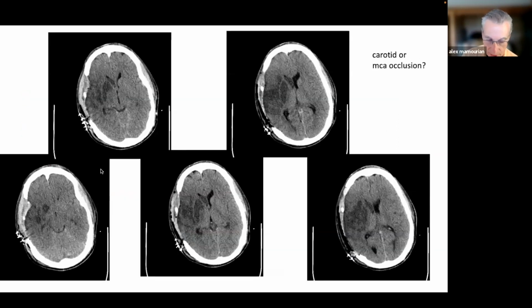So let's look at this case. We can see this patient has had a previous craniectomy to decompress this large infarct. As you know, steroids are not effective with infarcts the way they are with brain tumors. We rely oftentimes on creating more space with a craniectomy to allow patients to survive these large territory infarcts, which would lead to a gross herniation of the brain, so-called malignant infarct.